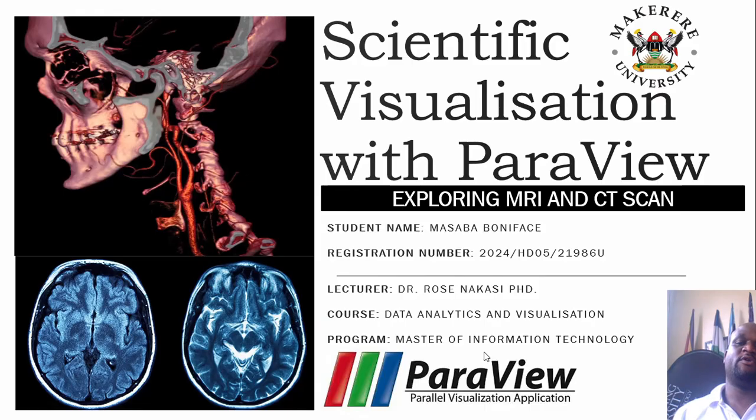Today, I'm going to focus on MRI and the CT scan dataset that I downloaded from a GitHub source. Now, my research has brought me to a conclusion that Paraview is highly preferred for scientific visualization, and MRI and CT scan datasets are a perfect example of data that has been produced as a result of scientific activities.